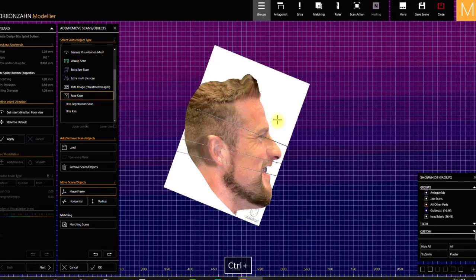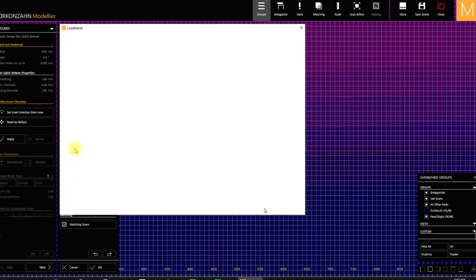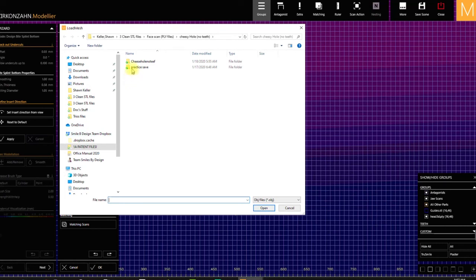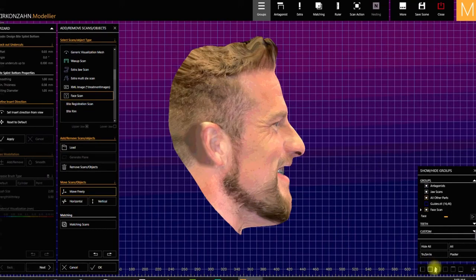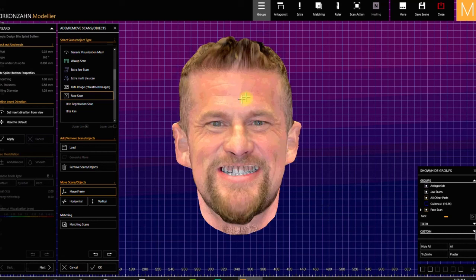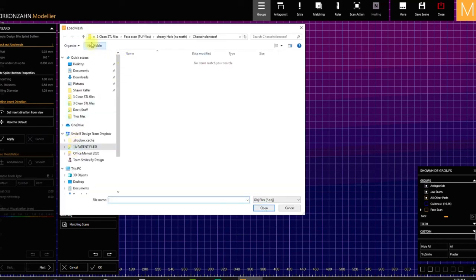So if you want, you can bring in another smile. Let's go to load. Cheesy, no teeth. Oh, why don't I see my scan? Because we're looking for objects. So go to that one and let's bring it in. It might be the same exact scan, I'm not sure. Let's hold down. Yeah, that was the same exact scan. So what other ones do we have? Cheesy smile.